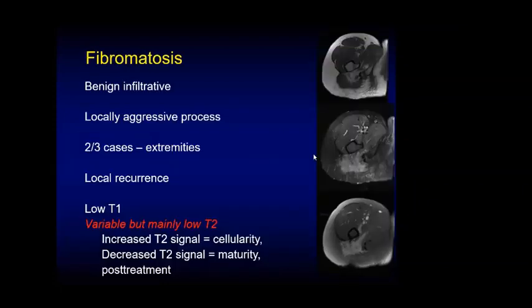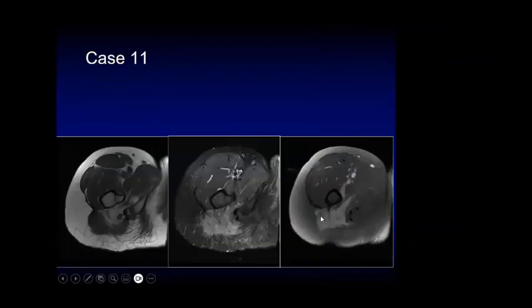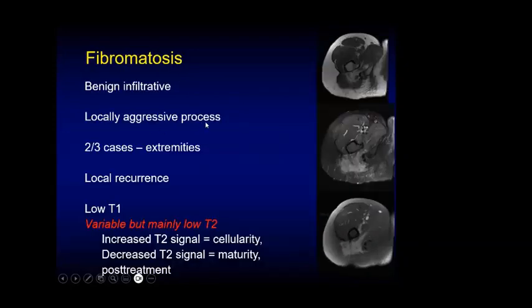This is fibromatosis. The reason we called it that, I mean, there was histopathology, but the margins of the tumor are very infiltrative. Fibromatosis can sometimes be very locally aggressive, as you can see with this one, because it's extended quite a bit. Even on the contrast, you see quite a bit of extension. They are associated with high local recurrence, even after surgical resection or radiotherapy.